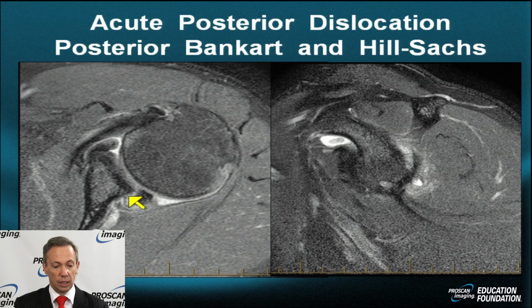Posteriorly, there is a tear between the labrum and the underlying bone, separating the two, but also the periosteum, represented by these small, irregular, low-signal foci, is fragmented. So there is both a periosteal rupture and a labral rupture, although the capsule, while stretched, is still attached to the labrum. This would be considered a classic soft reverse Bankart lesion.